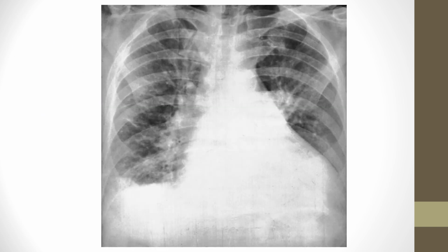So this is your classic chest X-ray where you're looking at this. See how hypertrophied the heart is, right? Big hypertrophy, and you see how fluffy the infiltrates are, especially in the hilar region. It's a classic pulmonary edema. Now this would obviously be a cardiogenic pulmonary edema on this patient. So very, very poor situation.